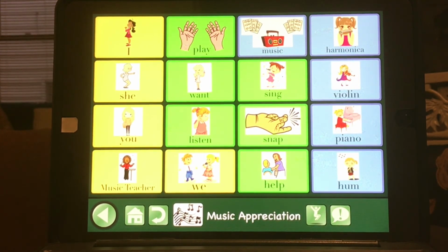Also, a home page could also be furbished with categorical icons that could snap to an entire page with corresponding vocabulary. And finally, once the client is forming complete multi-word sentences and has graduated to a level of functionality with the application, there is an extended express bar feature that could be activated for each display page. This bar will appear at the top of each page when enabled, which will allow the client to form quick sentences by swiping or snapping between pages and selecting their desired vocabulary, and then can easily present the entire sentence auditorily with a tap of the bar.